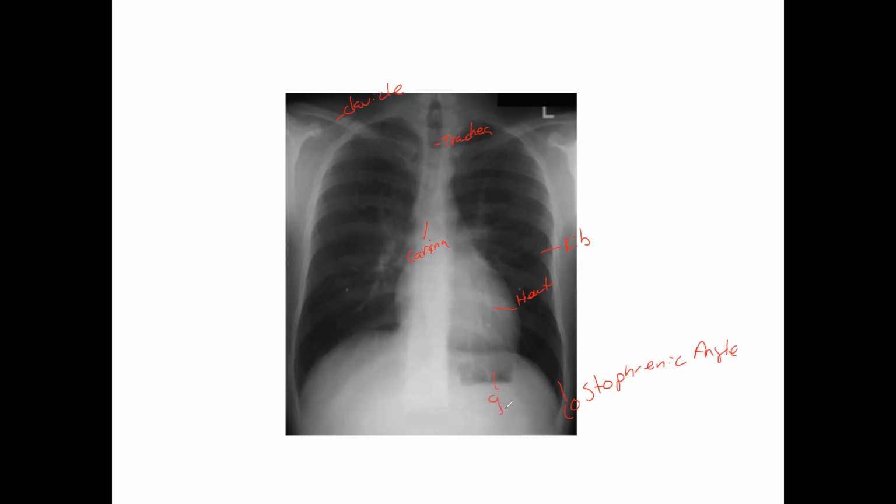Got your gastric air bubble. Gastric bubble. You've got your right hemidiaphragm.